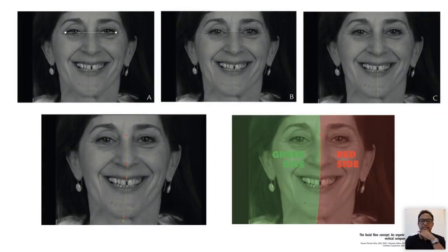Before I tell you what this is, I want you to take a look at the photo that has the letter A. This is the base of dentistry, right? We have here a horizontal line that goes from the corner of the eyes, and then you draw a line right in the middle of that line. And from here, you can determine the facial midline.